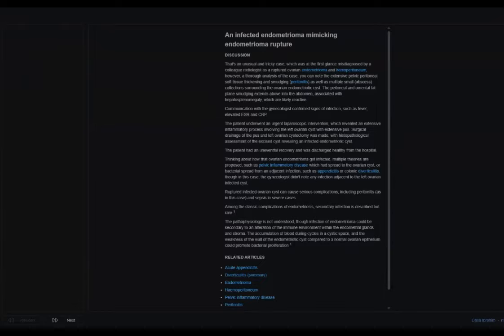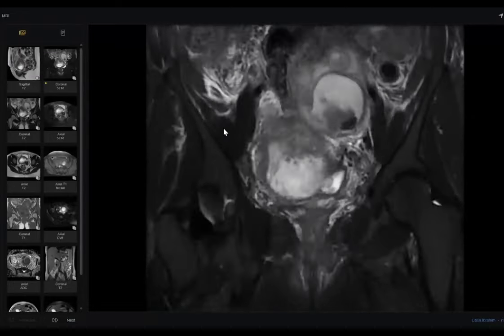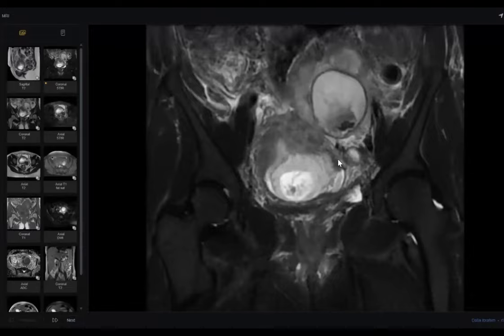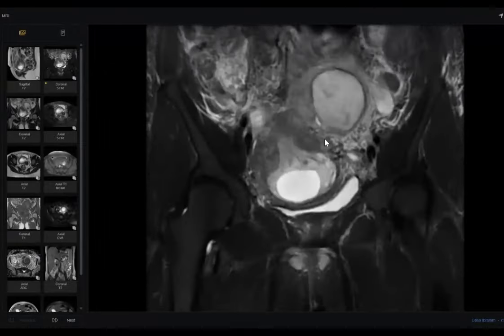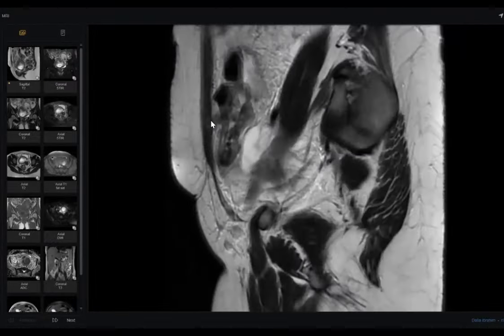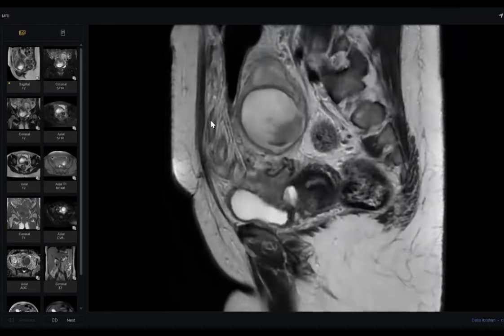Infected endometrioma. Even if you give the examiner some differentials like you did, it is very great. Heterotopic pregnancy, one inside the uterus and one extrauterine. Ruptured endometrioma, ruptured corpus luteum, abscess, because it is restricted. But here, there is a dark T2 spot, dark T2 spot sign and the shading sign.